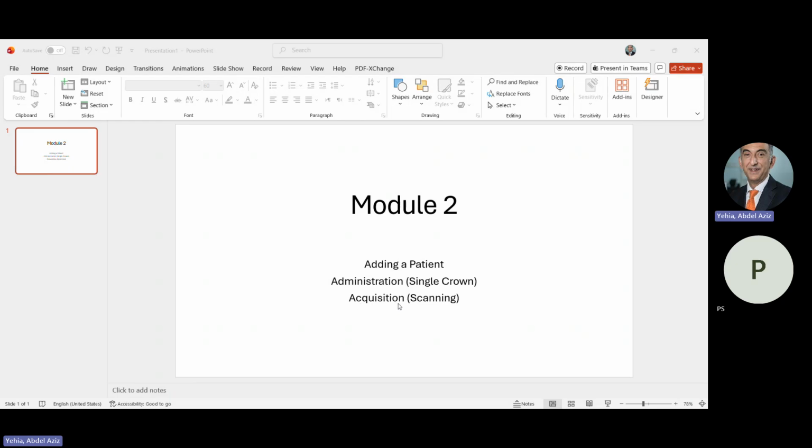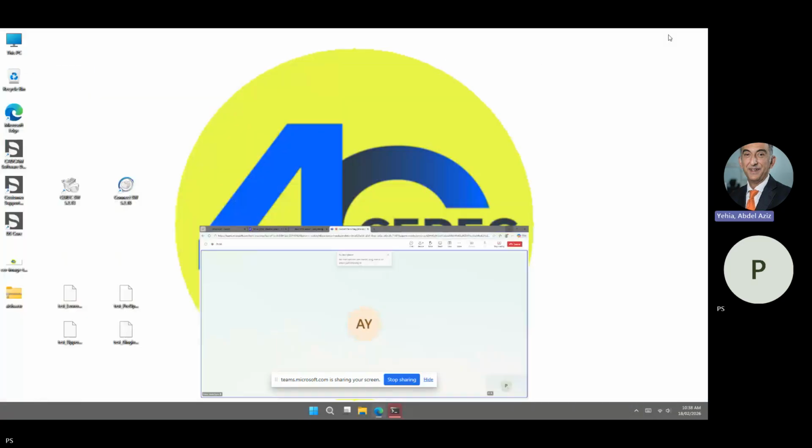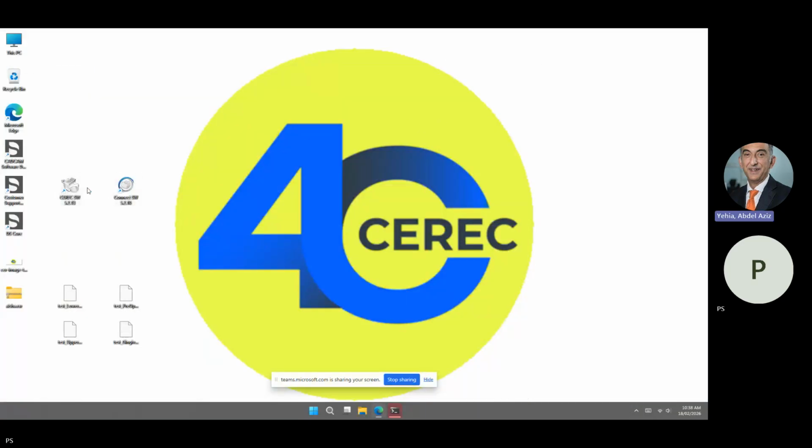So let me share the screen from the PrimeScan and start the Connect software.